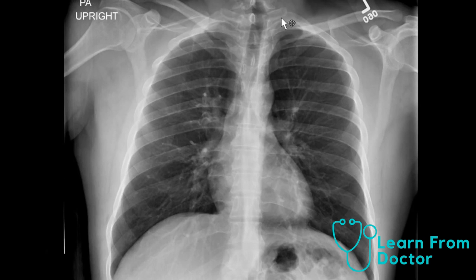Then what I do is I start at the right first posterior rib, and I count each posterior rib on down. I do this quickly with my eyes, but for the sake of this video, you'll see me follow each posterior rib. Then what I do is I come over on the left, follow all the posterior ribs up, because sometimes you can see a nice posterior rib fracture on these radiographs.